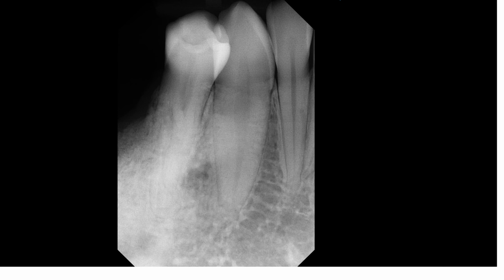In this video, we're going to discuss the benefits of taking cone beam CT for endodontic cases. So take a look at this periapical radiograph of tooth number 27 and 28. Hypothetically, let's say this tooth number 28 needs a root canal therapy, root canal treatment. In that case, how would you assess the overall root morphology or the pulpal morphology of number 28?